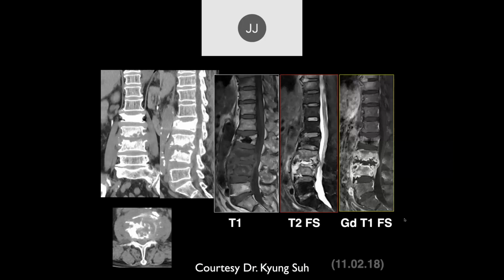So here we can see what the CT scan looked like. This is obviously later. And what do you think's going on here? So there's been a progression in osseous erosion. The discs still look pretty well preserved. Okay, so here's where they injected the vertebral body. And now we've got diffuse edema, which is much worse than it was before. We've got erosion of the end plates here.